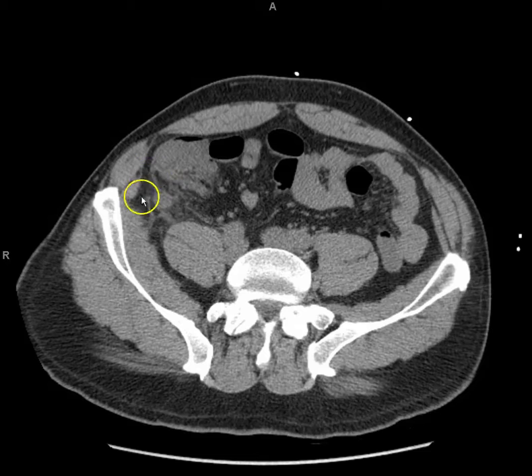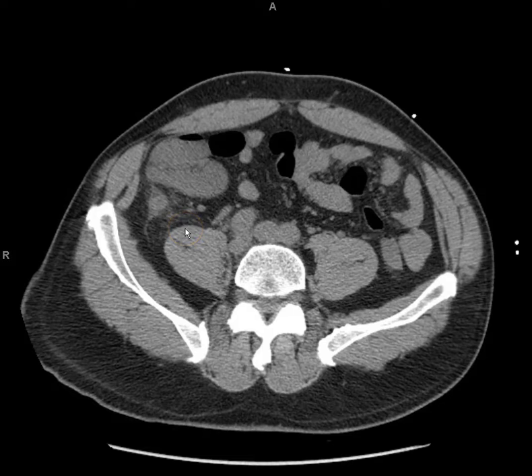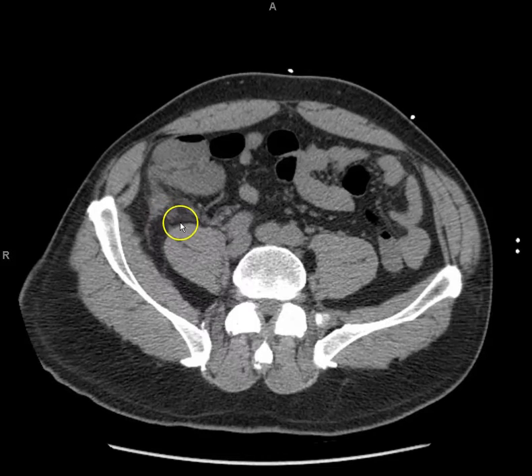So this is the appendix with inflammation around it. You've got appendicitis. And you can see how this is irritating your psoas here. I didn't see that. Well, just see the inflammation is right on the psoas. Right? So what would be a positive test in a patient like this? Likely a psoas sign. Right? That's a good indicator of a retrocecal appendix.